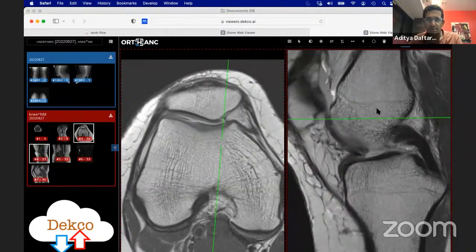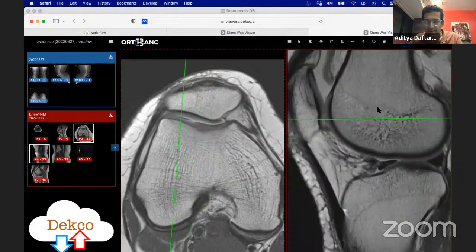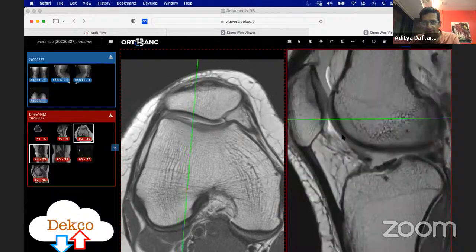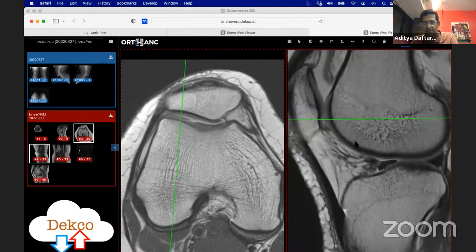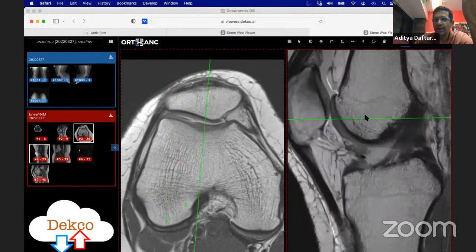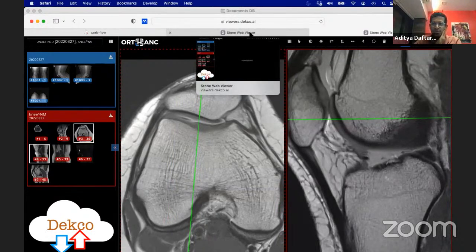let's get towards medially, you can see this fine. As you come laterally here, you suddenly find that there's an area where the cartilage is lost. Notice how this cartilage is pretty thick and nice, and as you move laterally, there's an area where you lose cartilage and then it comes back. These are hard cases, but I think they illustrate the point nicely, because when you send us a patient with anterior knee pain and we send you back saying we don't know what's going on, as opposed to telling you there's a discrete cartilage defect and giving you a measurement for it, it helps you figure out what you're going to do next, even if you're not going to fix it.